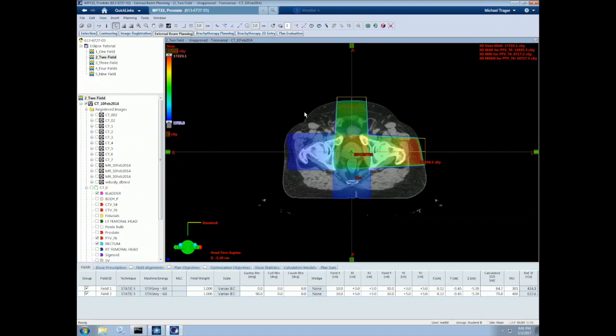This is because we need less fluence, and consequently less dose, from each field to reach the prescription dose of our target. We now have those same PDDs, however, since we have two beams contributing to the dose, they can add constructively to allow a higher dose at the center than at the surface.